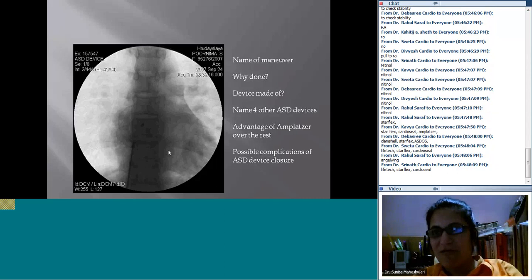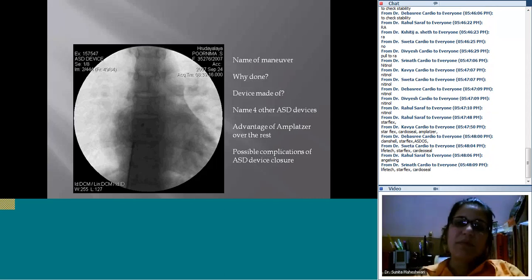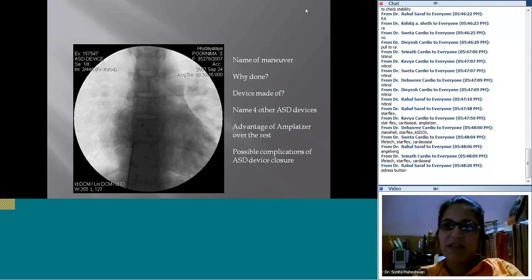So, okay, guys, now remember that Life Tech is actually a company. So the Life Tech device is nothing but the same device. Yes, now we're talking. Cribriform device, right? The Life Tech device is nothing but the Amplatzer, and it's a Chinese make. So your Life Tech, your Blockade, your Amplatzer, these are essentially all this. They're all going to look the same.